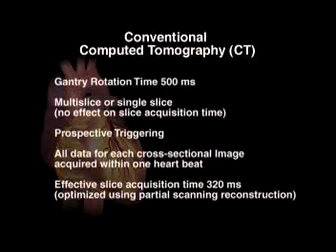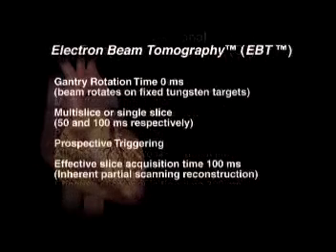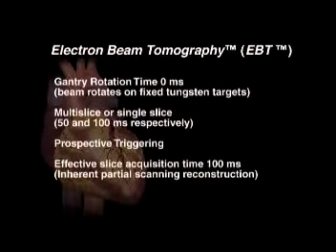The performance of a state-of-the-art prospectively triggered multi-slice computed tomography, or CT technology, optimized using partial scanning reconstruction techniques, is compared to Imatron's state-of-the-art prospectively triggered electron beam tomography, or EBT technology.